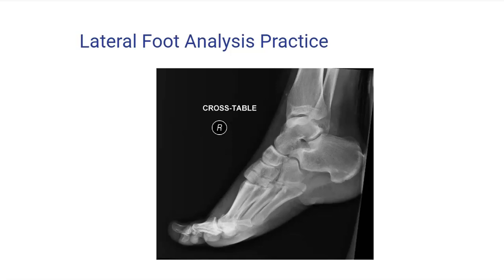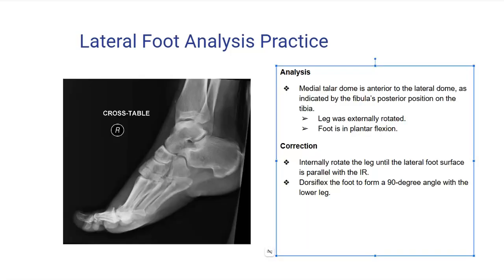Go ahead and review this first practice analysis and answer the following question. So let's review this practice analysis together.